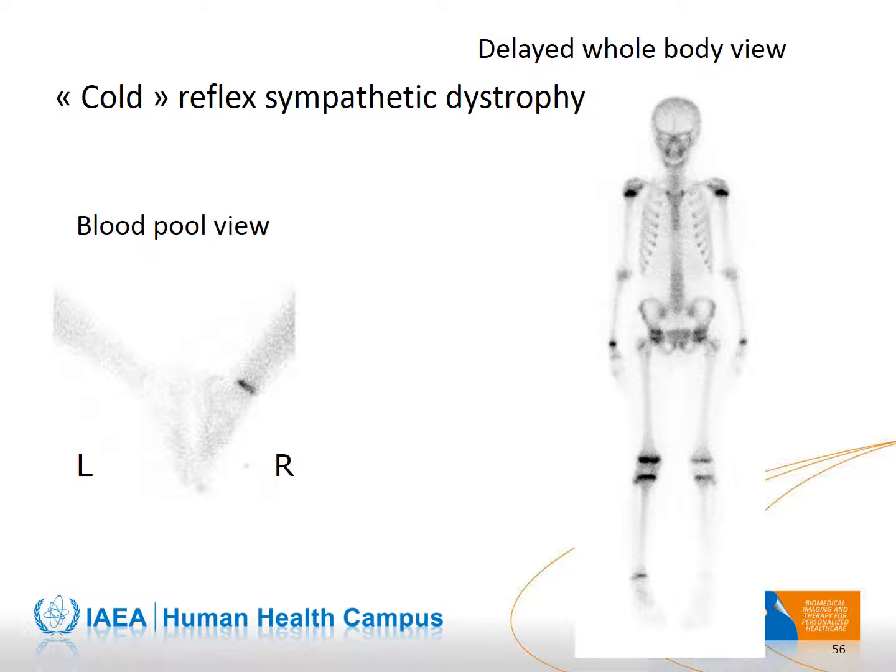Yes, he has cold reflex sympathetic dystrophy with decreased blood pool of the left leg and decreased tracer uptake on the delayed view.